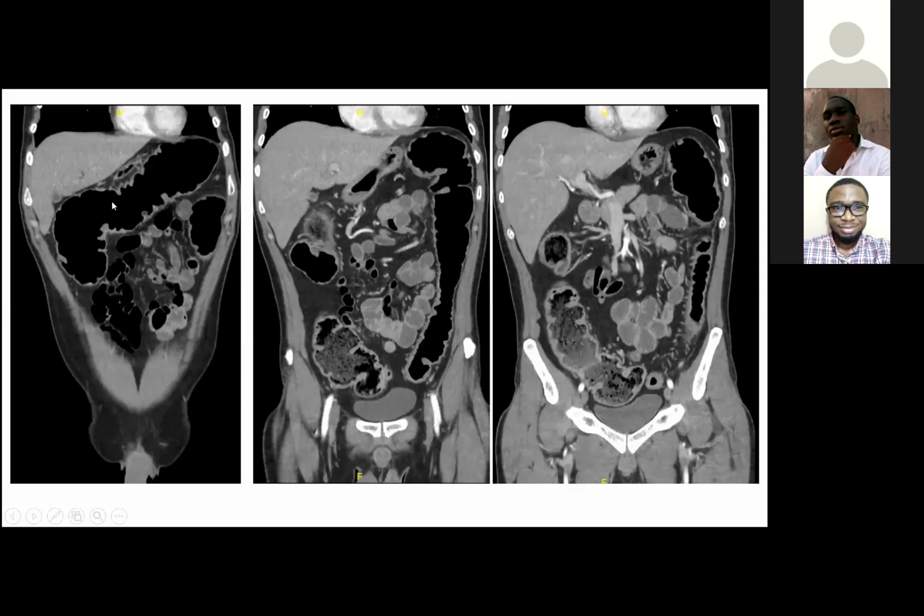And you can see from the CT scan a few slices. These are done coronally. And you can tell that this looks a bit like what the plain film looks like, which is distension of the colon with an absence of fecal residue. And the whole of the colon is thickened and edematous. And this guy has got a pancolitis. This was a young guy who had ulcerative colitis, and eventually was taken to theater and had his colon removed because of the concern for toxic megacolon. Okay.